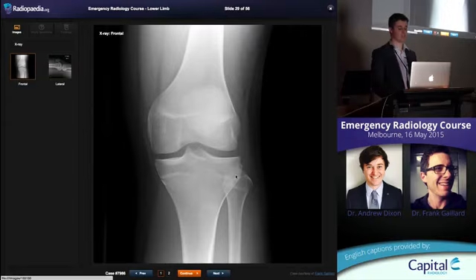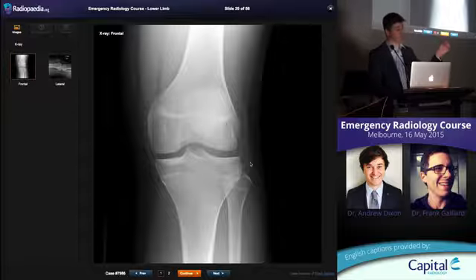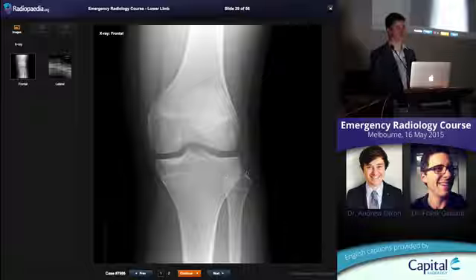This is where the posterolateral corner structures all come down and insert on the knee. It's not just the fibular collateral ligament. In fact, that lateral collateral ligament is very, very thin, cord-like. The main thing that inserts down here is the biceps femoris tendon and the arcuate ligament complex, which is a strong stabiliser at the posterolateral aspect of the knee. If you've avulsed bone there, you've obviously injured that area.